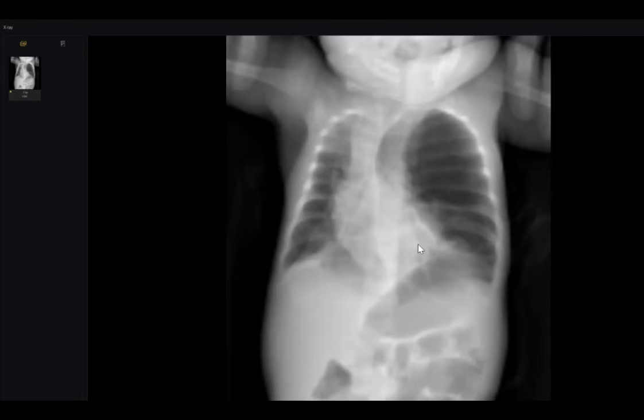Congenital sir, CPAM. What about this side? Which side is the pathological side? Left or right? Sir, in this case, I think this is the left lung field. Okay. Why is this not the pathological side?